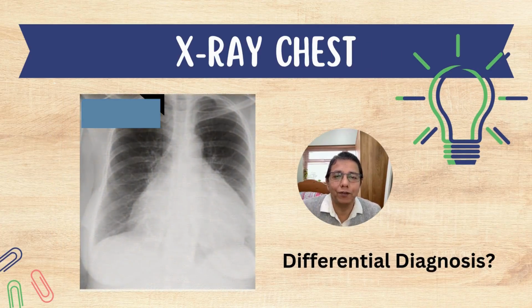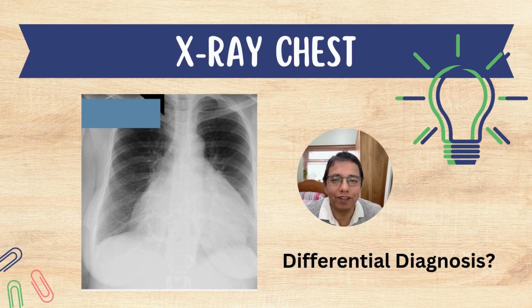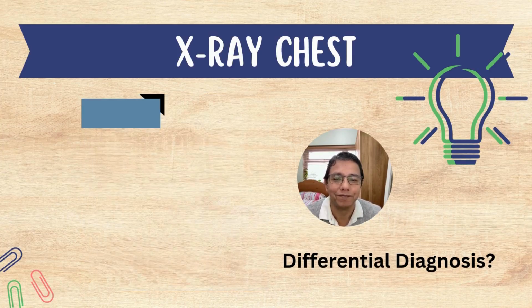So later in the afternoon, when the registrar had time, she had a look at the X-ray, and this is what it looked like. Think about the differential diagnosis for this, and then we'll come back again to talk about it.